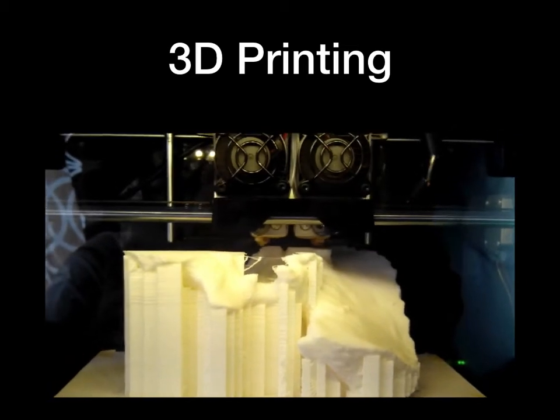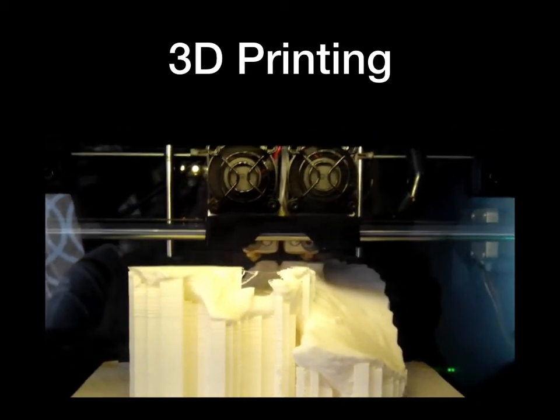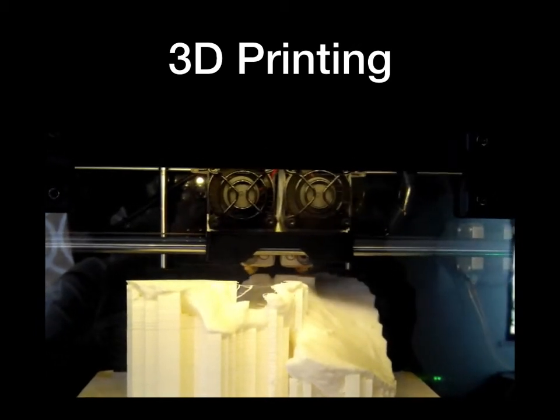On the top side you can see the ilium. At the moment the acetabulum is being printed, and the other side is the ischium. So that is how a typical 3D printer works. I call it a jalebi maker. Those familiar with the Indian sweet jalebi, it kind of extrudes the jalebi liquid and forms a solid 3D model.